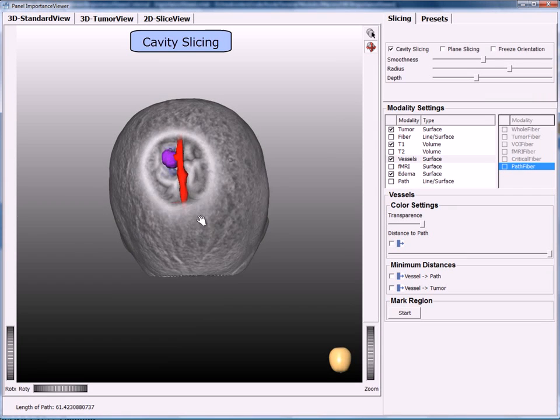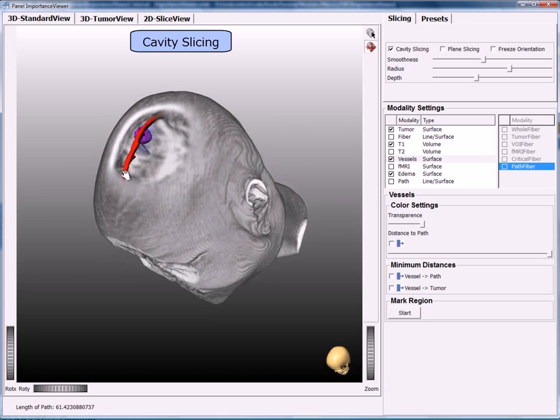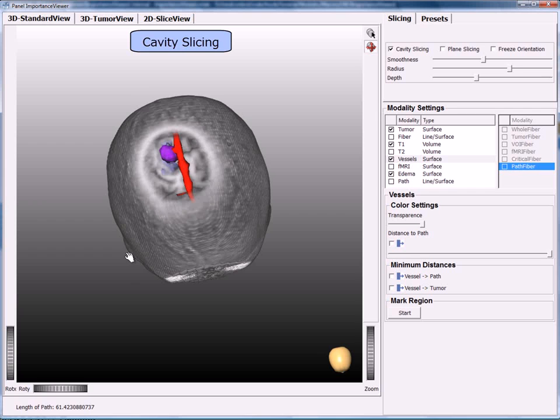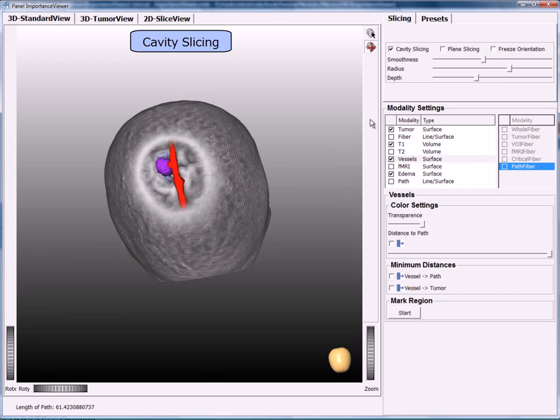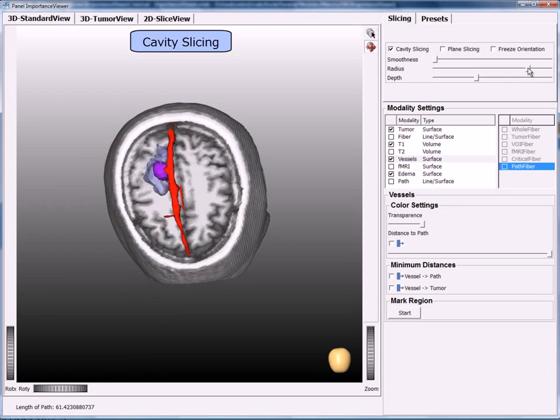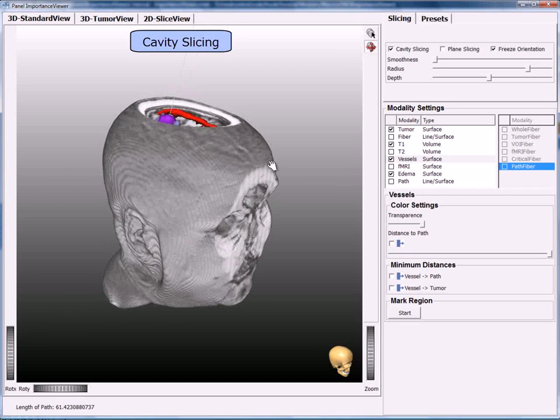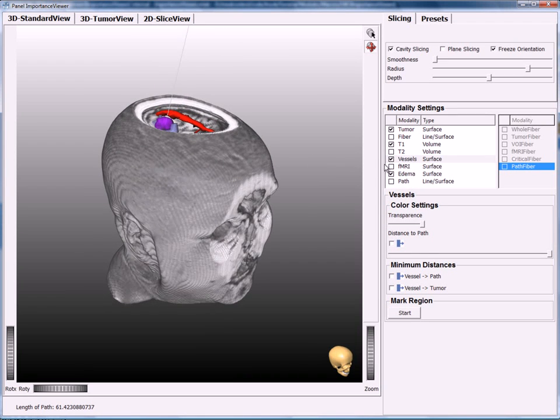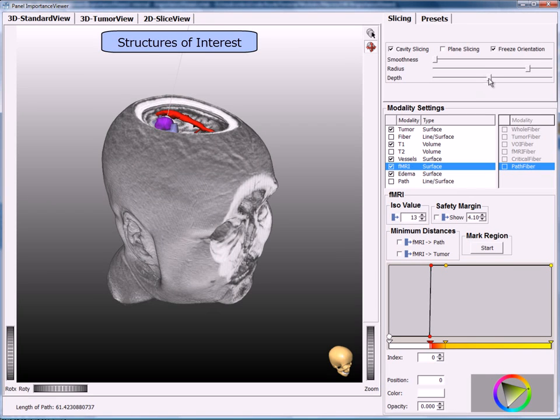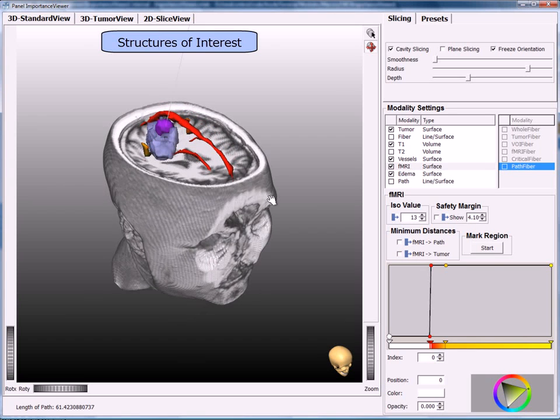Adjusting the smoothness enhances the view on anatomical structures as well as the depth perception when looking from the outside. Loading vessels, activation areas, and the perifocal edema to the sliced T1 weighted volume provides spatial distribution of the tumor's position.